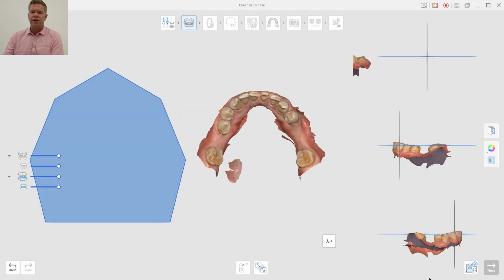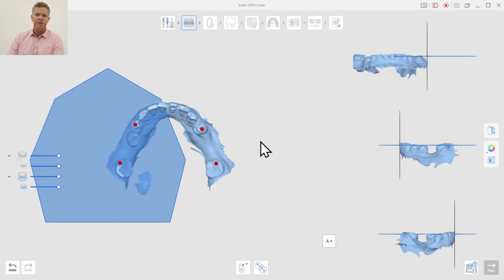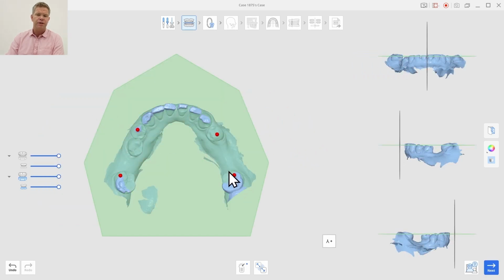Again, there's a lot of wear on this tooth and it's missing teeth, and so some of these early steps are going to take a little extra work here. The AI cannot find the normal points, so I'm going to place the points on the cusp of the fours, and instead of the distal buccal cusp of the sixes, which are missing, I'm going to place them on the mesial buccal cusp of the sevens to find the occlusal plane.